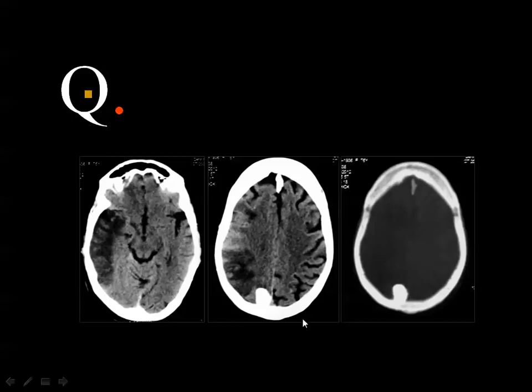Axial CT without contrast, soft tissue and bone window, showing a calcified lesion adherent to the inner table of the skull, and a hypodense lesion in the temporal area on the right side. And this is bone. Bone. This is infarction, okay. And then this infarction does not exert a significant mass effect. It may be a subacute infarction. And what about this lesion?